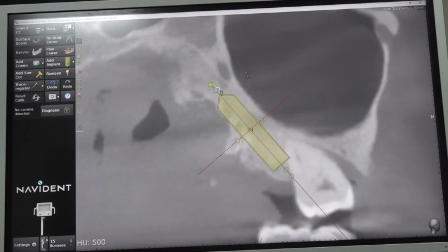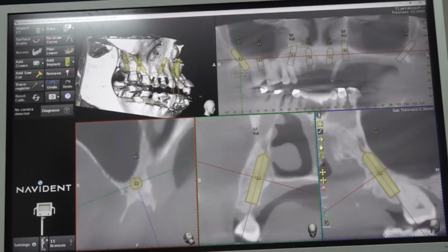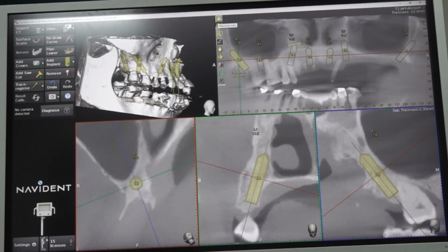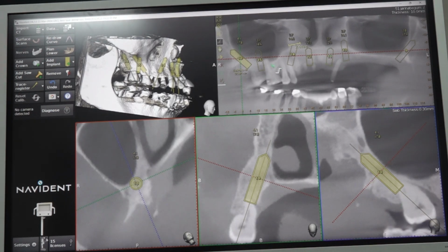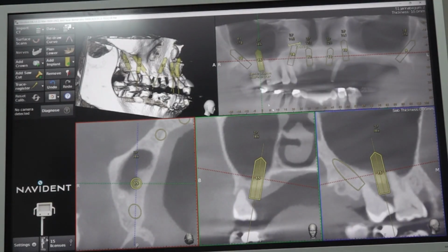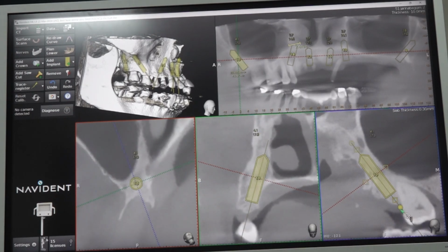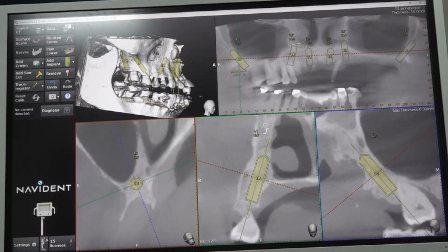Start drilling from here also. Okay, this is also from the crest. You avoid the socket and you start the drilling from the crest. So you will be getting more straight angulation. No? So the target angulation will be much better. If you start from here, it will be more easily treated. Right? So the design is quite challenging. So if you start the drilling from the crest, slightly distal to 7. Sorry, the mesially migrated 8. Almost the angulation will be much better. You can get in much better.